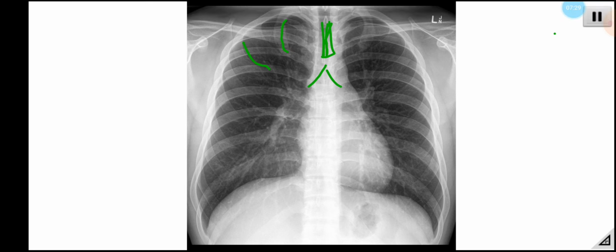So what we do is the first rib, up to the second rib, that's the upper zone. Remember, okay, it's the anterior ribs. From second rib to the fourth rib, this is the middle zone, and anything that is below is the lower zone. This is just for our convenience, so that we can compare one side with the other. If you look grossly over here, you tend to miss things. So upper zone, anterior two ribs; 2 to 4, that's the middle zone; and anything below is the lower zone.